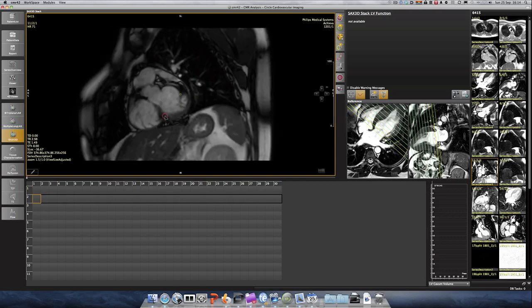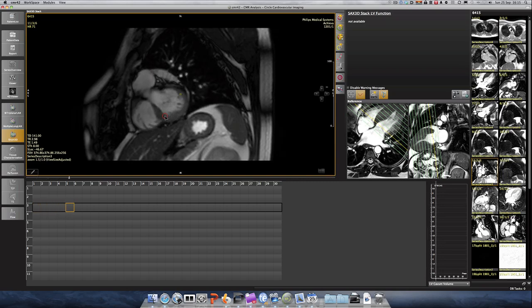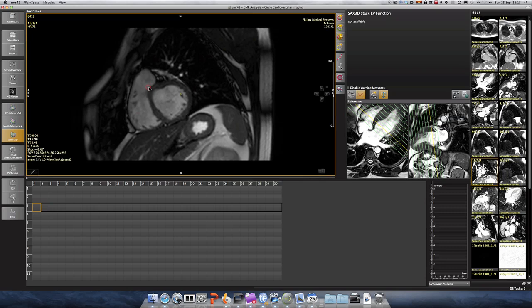So that's right atrium. I think that's still more right atrium than right ventricle, even though I think there's some right ventricle in there. This has got clearly the shape of the right ventricle. So here, yeah, it comes in, no doubt about that. Further down now, we're getting to the right atrium. So now here, this is right atrium again, and pulmonary valve. But if we go back, here clearly I would include all of this as part of the right ventricle. And this is clearly all left ventricle.